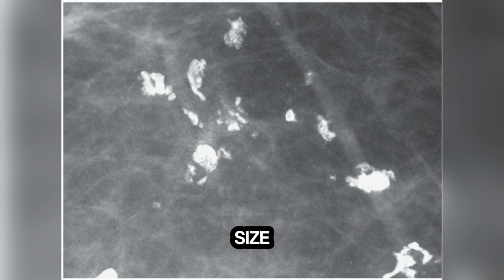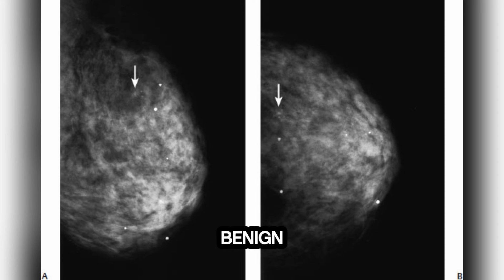Stromal dystrophic calcifications are dense, coarse calcifications developing in fibrous tissue and not a predefined space, and are variable in size, density, and shape. They may be focal, limited to areas of prior surgery or trauma, or diffuse, and they belong to the benign entity.